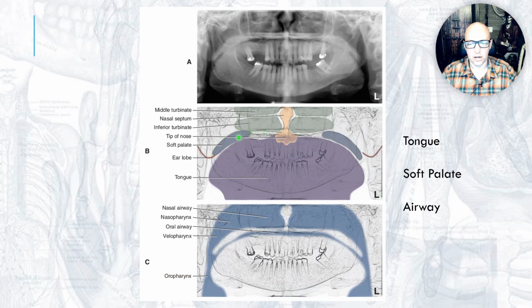I also know the soft tissue structures, that's what we're seeing here. So we have our panoramic radiograph, and then they've labeled some things. The purple is what? Is the tongue really that big? It just looks ginormous in a pano, right? Because of panoramic geometry, things are stretched out. That tongue sits on that point of rotation for quite some time, and so it just makes the tongue look like it stretches all the way across here. This is all the tongue.